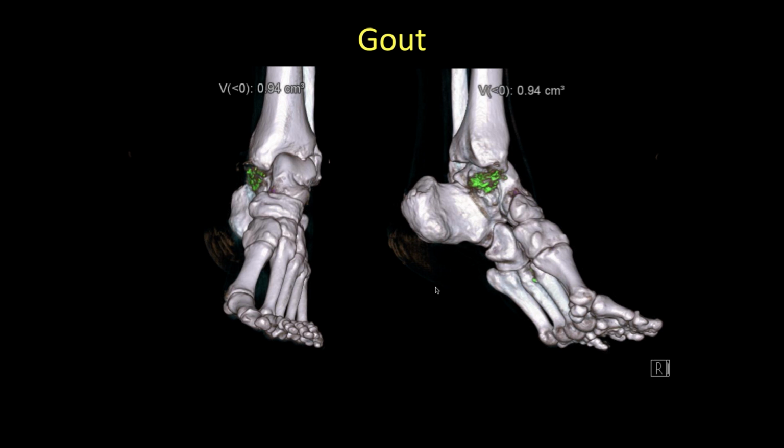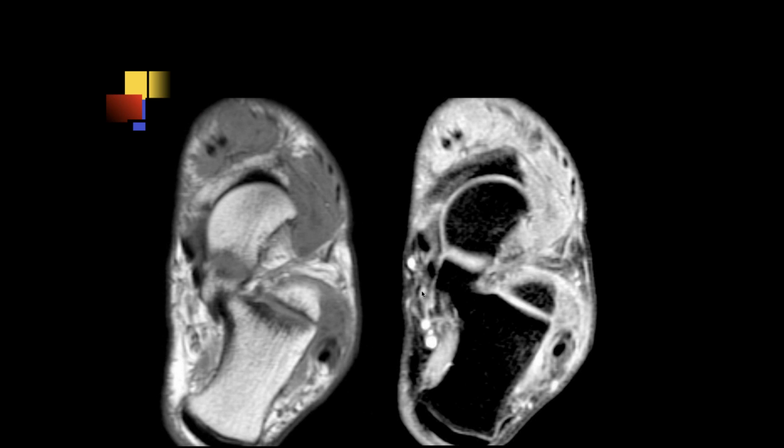Yeah, there have been a number of big gouty tophus type things. There have been several papers published where they've used CT to see if it improves the outcome and diagnosis of gout and the management and so forth. And most of those papers have said that it's not very useful. But occasionally, if there's a concern, I think doing dual energy CT can be helpful in establishing that you do have uric acid crystals and making the diagnosis in questionable cases that aren't obvious from the clinical and other imaging findings. So this just shows how you can use dual energy CT to help with the diagnosis.